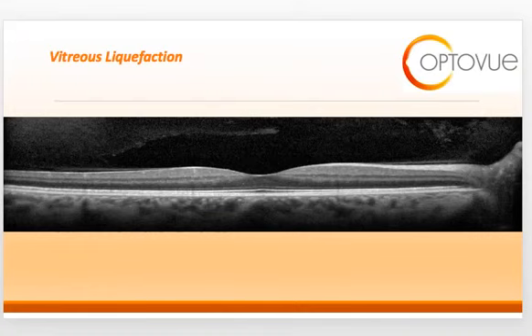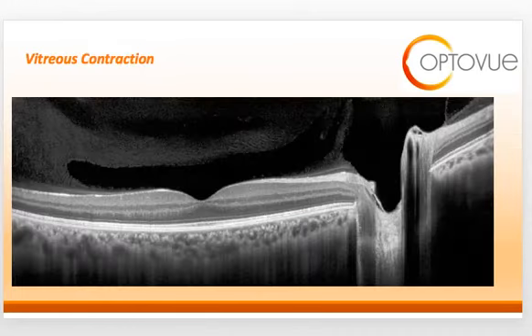And you can see that within the black space on top of the OCT scan, there's a lot of grayish stuff floating around there. That is the liquefaction of the vitreous, and it's beautifully illustrated on the OCT scan. This slide shows the second entity, vitreous contraction, or the anterior displacement of the vitreous.